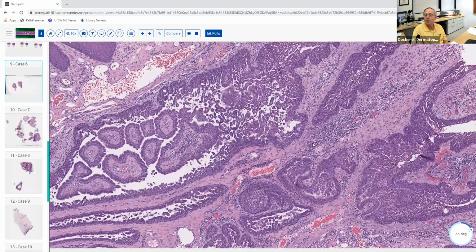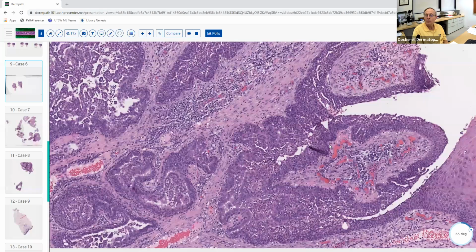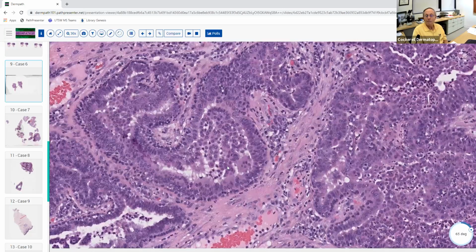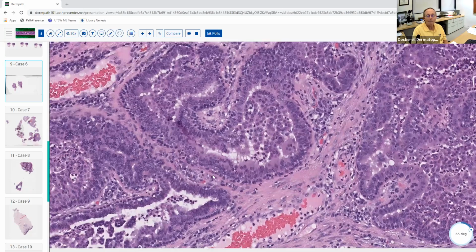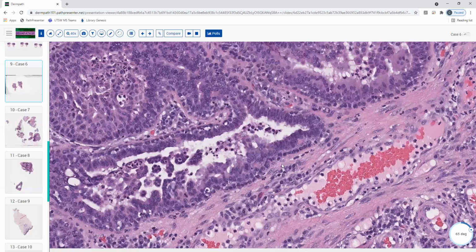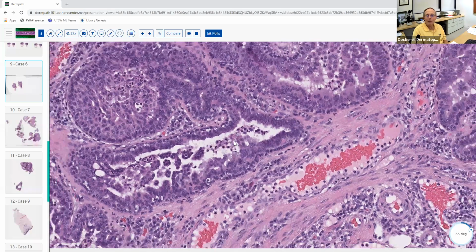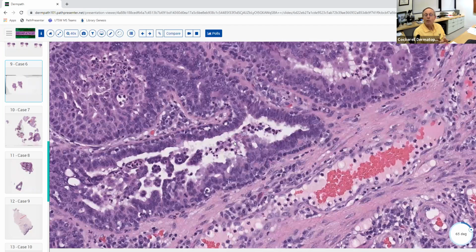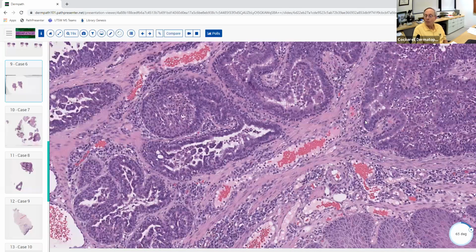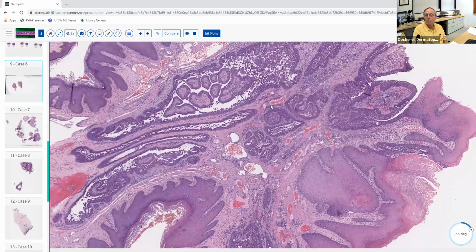What's the differentiation of that? As in apocrine, eccrine? Yeah. Which one of those is that? So let's see if we can see any, because if it's apocrine, you can see some decapitation, which it looks like we can, and they're releasing the contents. So that's awesome. Good. So Syringocystadenoma papilliferum is a benign adnexal neoplasm of apocrine differentiation. So yes, that's exactly right. And that's what this is. And hidradenoma papilliferum, you're right, generally tends to be situated on the vulva.